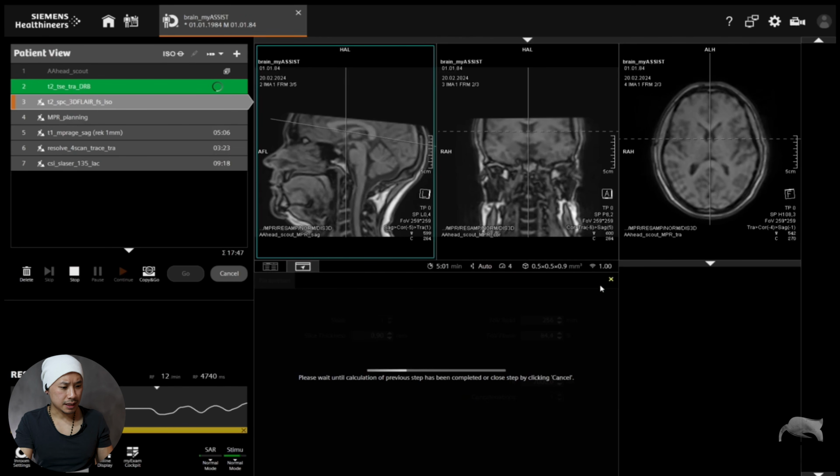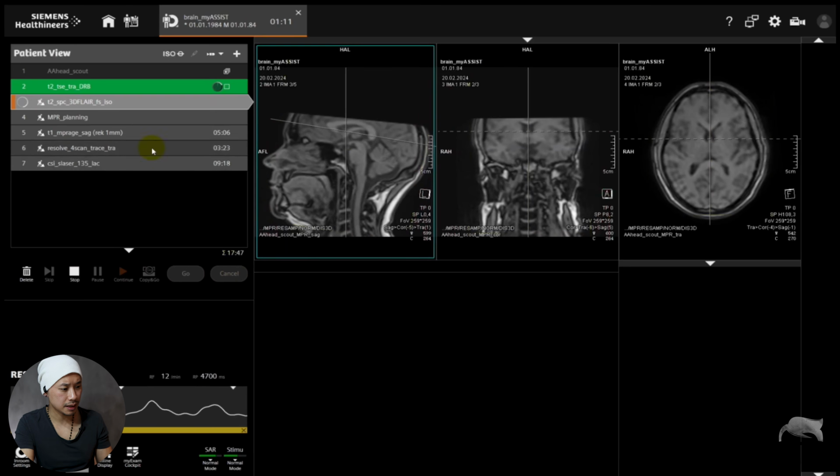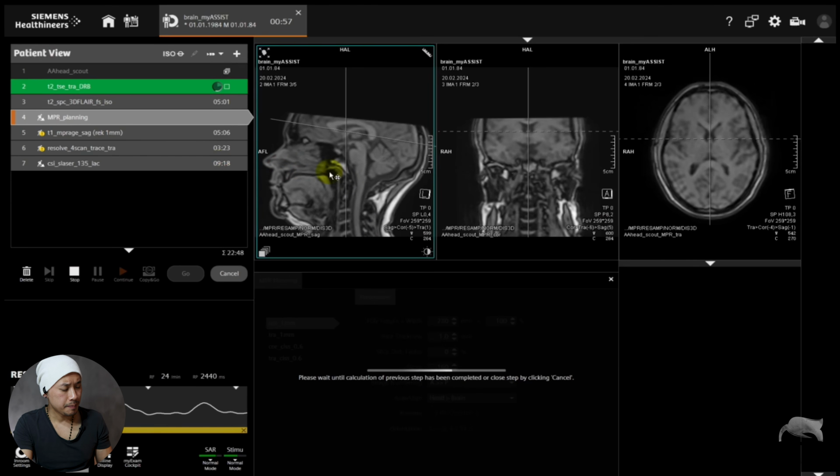So I could just exit out and then suddenly, voila, I have the opportunity now to position as I want. If you already X out on that specific sequence, that means that message will never pop up again for the rest of this exam on that specific sequence. Let's see here. I cancel, I open it, you see it suddenly opens itself. So you already put the cancel.